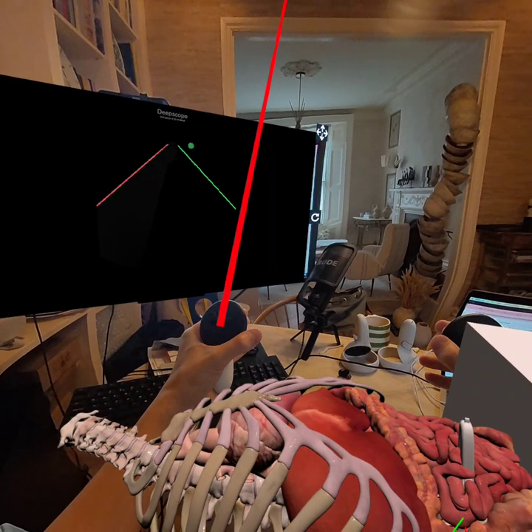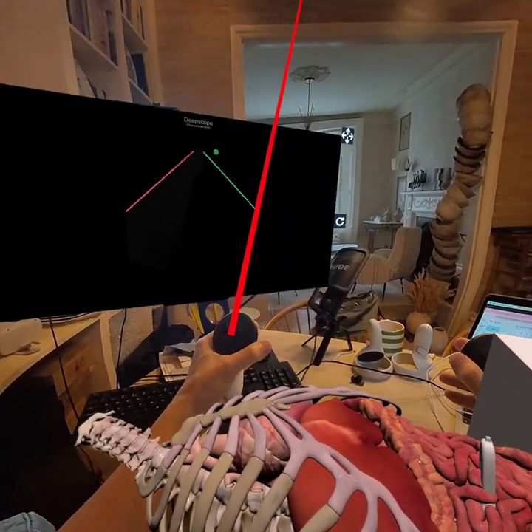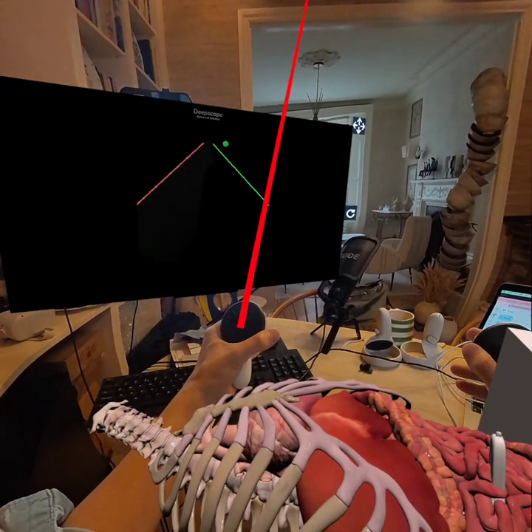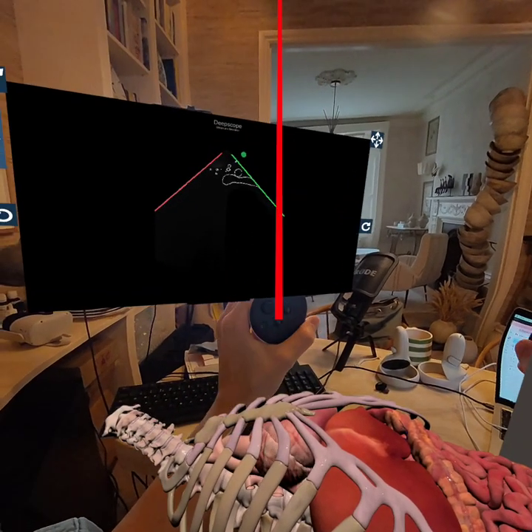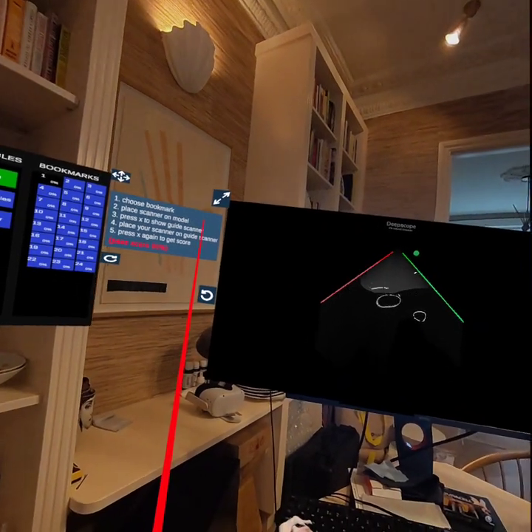And if you want to put it on a physical mannequin, then just try and get it to the right size and place it in. Or if you want to put it on a person, do the same thing. Okay, so I'm going to say that's about right, and let go of both of the controllers, and then you're good, and the mannequin's there.